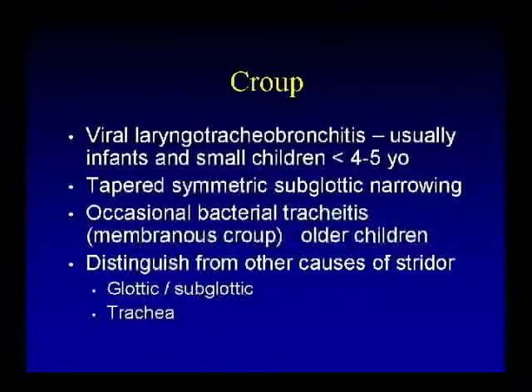Here's another frontal view, which is more characteristic. It's easier to make the diagnosis on the frontal view, and the lateral view is often misleading because the narrowing is more side to side than front to back. But in this case there is some narrowing in the subglottic trachea, and occasionally during inspiration you'll see ballooning of the hypopharynx. It's a fairly common disease. We don't image all children with croup, and if we want to make a positive diagnosis of croup, the frontal view is better than the lateral view. But often we get lateral views just as a remnant of looking for epiglottitis.